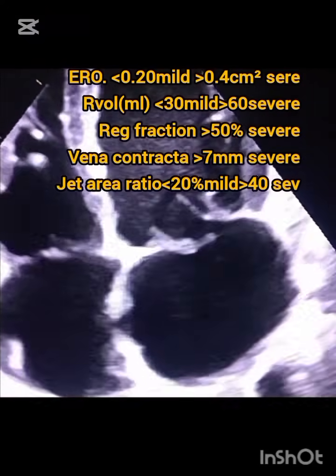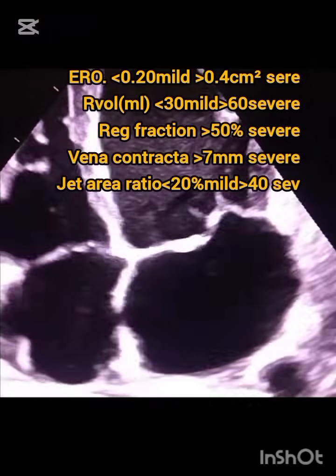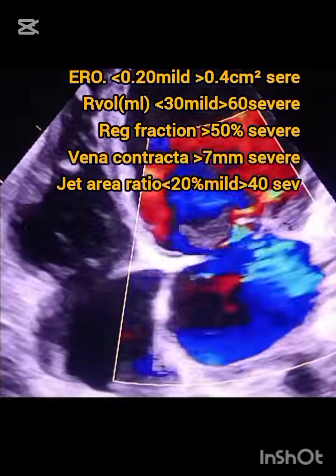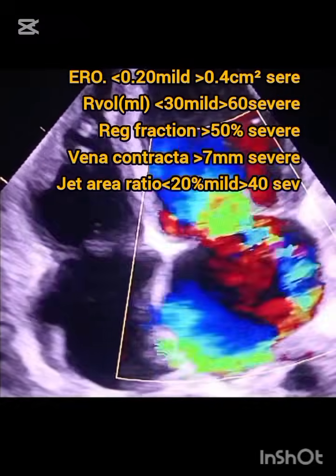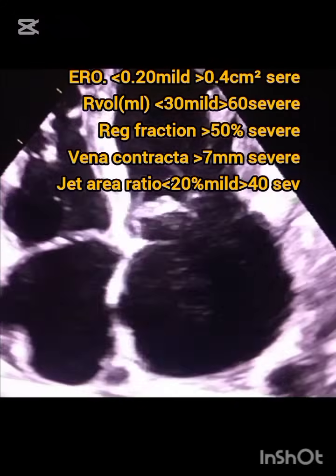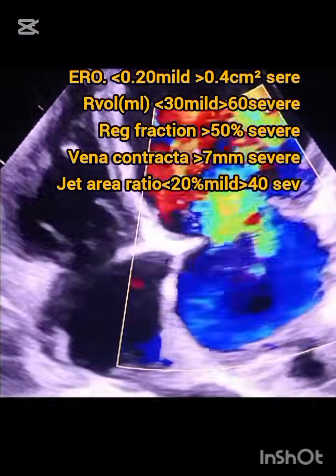The vena contracta less than 3 mm will be mild, and greater or equal to 7 mm will be severe. Jet area ratio less than 20% is mild, 20 to 40% is moderate, and greater than 40% will be severe. So these are the parameters of severity. Take a note of this.